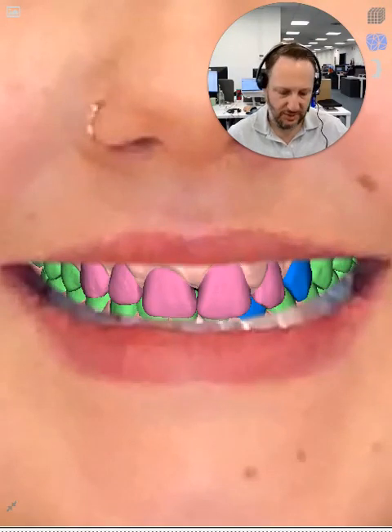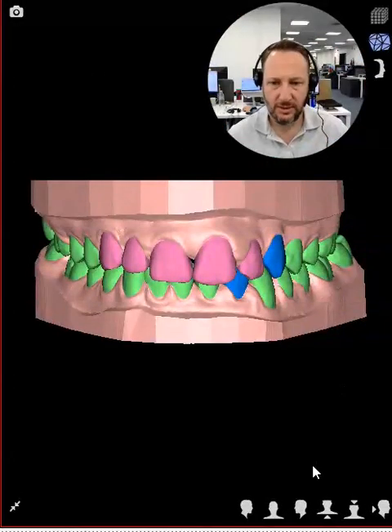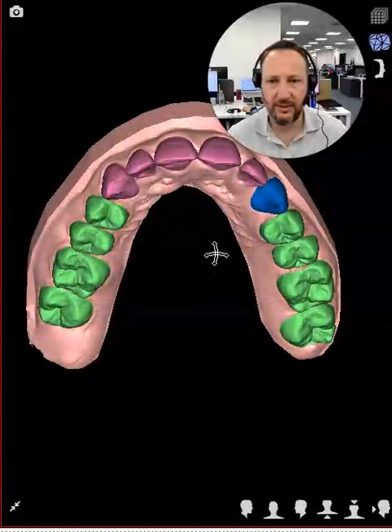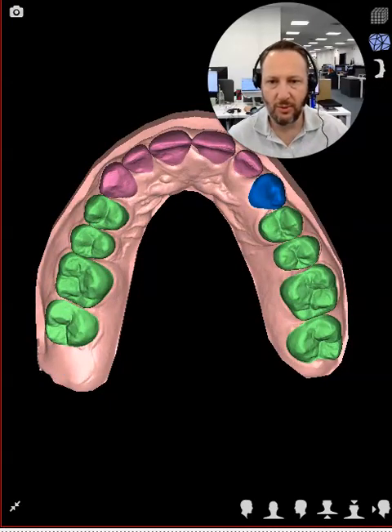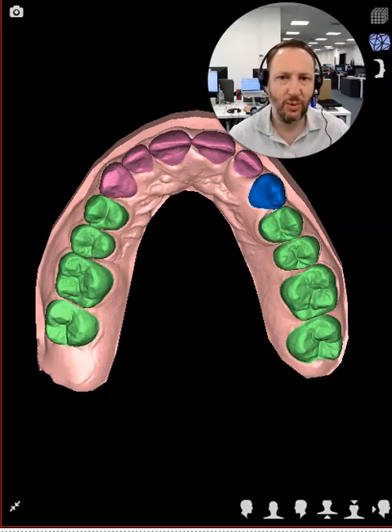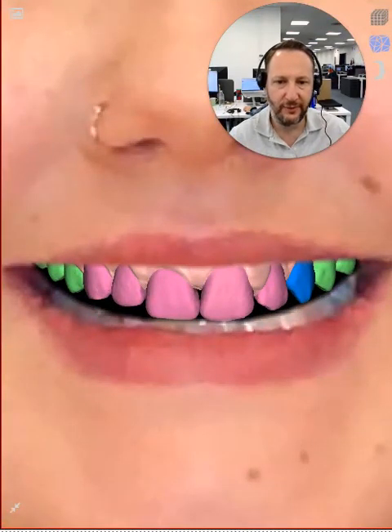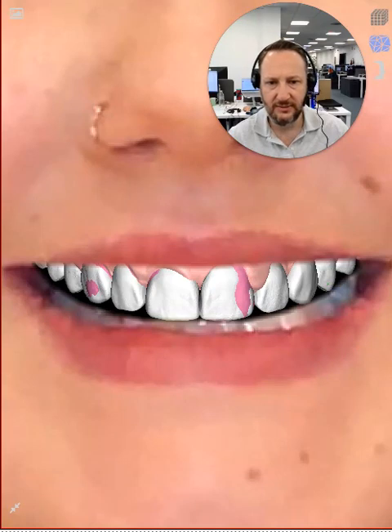We can also, in the patient's face, remove the lower arch. And let me remove it here so we can better see all the movements we need to do, in several angles, and evaluate if this is something ortho can do with this expansion. We can compare initial and final. So it's a great exercise for us to better plan our cases. And as I mentioned, when having this final design, deciding if we're going to add restorations, we can bring this idea that you see in white to the patient's face and check if this is something that is going to be good.